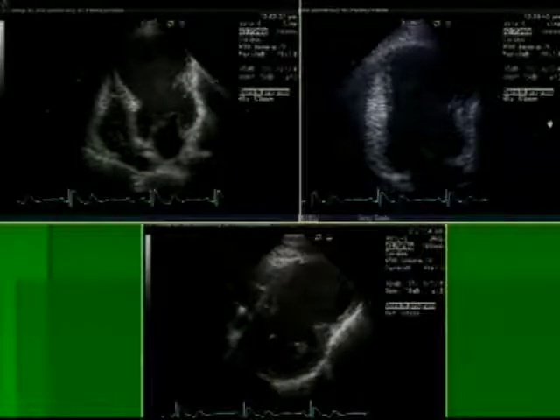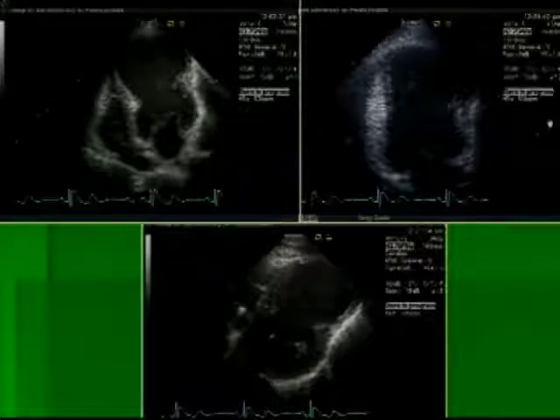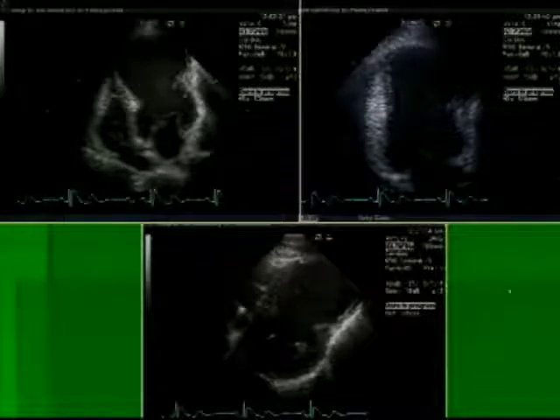And then the short axis view is perhaps the most striking of all. It almost looks as if there are two ventricles, short axis, side by side in this particular case. It's an enormous anteroapical aneurysm. Now, one of the things that we have a problem with is determining whether there could in fact be small thrombi within something like this.